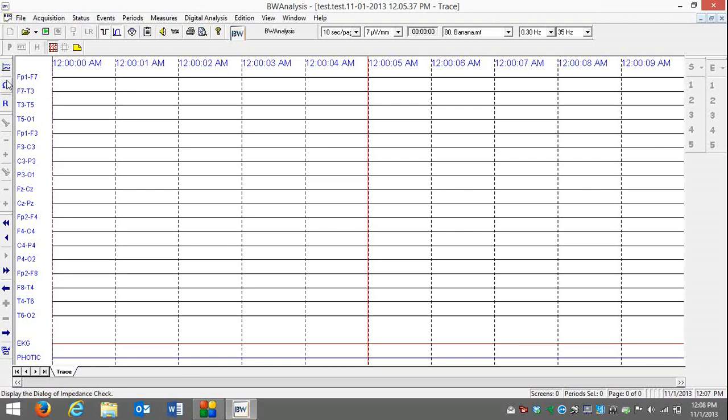Getting started, play record. We have our start and finish button. This is our start finish. And right next to that we have a record button.